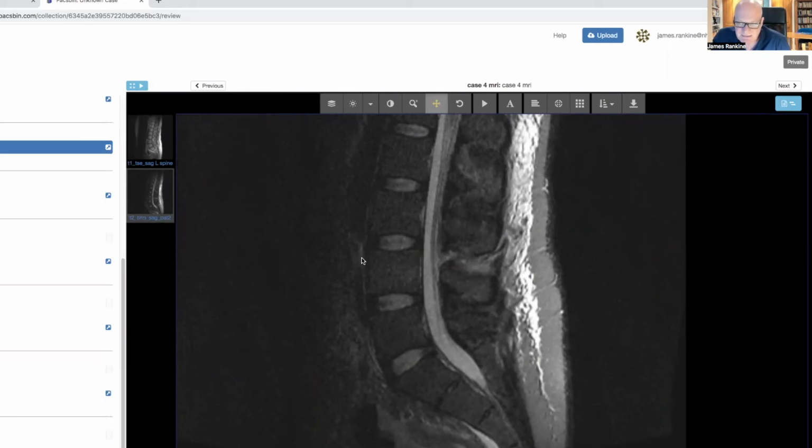And you see here, there is absolutely no compression of the vertebral body. And this is because the fulcrum of flexion has been anterior in this case, so that the spine has bent over, pivoting around anterior to the actual spine. So it's not compressed the vertebral body down here.